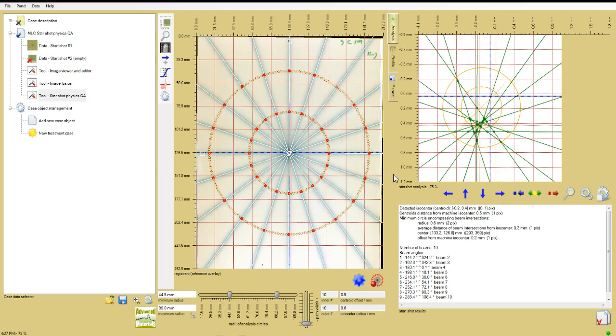The second adjustment concerns the width of the analysis paths. Up to a point, wider analysis paths are better because the pixel noise is dampened by an averaging process. But for the larger analysis circle, the wider lines must not extend past the end of the beam lines, nor should they overlap the fiducial marks. For the smaller circle, the analysis line should not be so broad as to come close to the area where the beam lines come together.